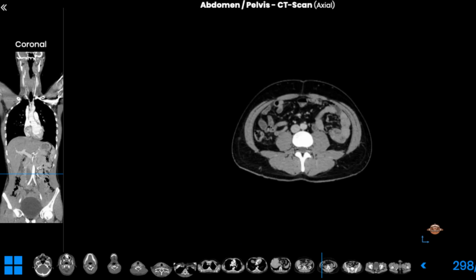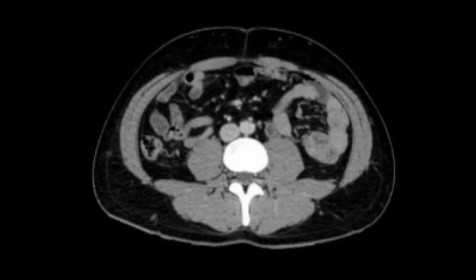Absolutely the same muscles are visible here. The rectus abdominis on the right and on the left with linea alba in the middle. The external oblique, internal oblique, transversus abdominis on both sides. The quadratus lumborum posteriorly here, and the psoas major, the round-shaped muscle just in front of it. So you see the picture is almost identical.